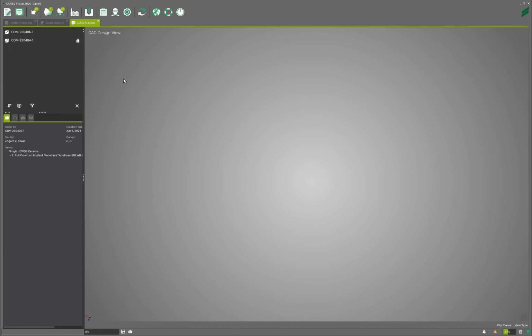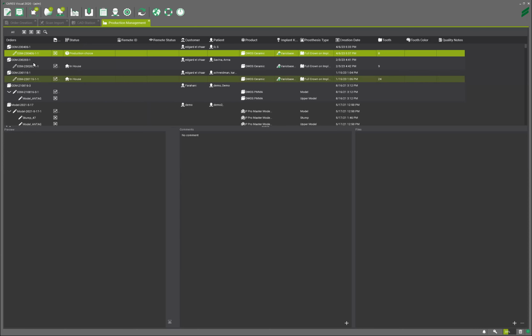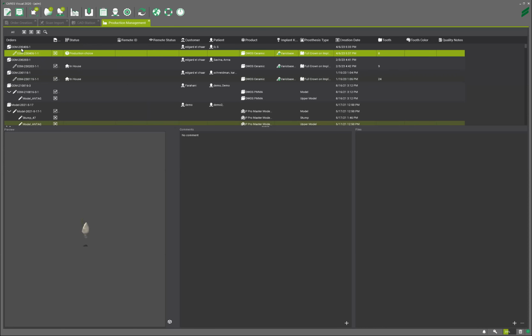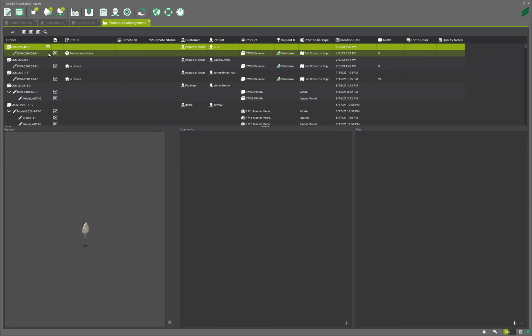And now it takes me here. That is her. And I'm gonna press on this. All right, I'm playing games here, I guess.